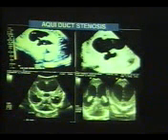Then not only that, at times we can see obstruction at a different level, and this is the case where we find aqueductal stenosis. This is a dilated ventricle, this is the third ventricle, this is the foramen of Monro, and this is the aqueductal stenosis. So this is again leading to obstructive hydrocephalus, and these patients need a shunt operation.